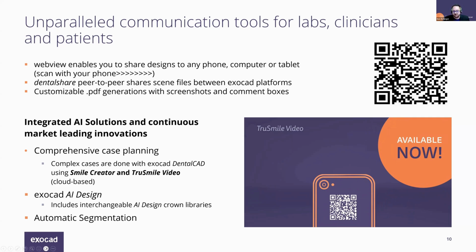The next option here is Dental Share. For all you exocad users, this is a peer-to-peer free service for active licenses that will allow you to share your design case with another exocad user.